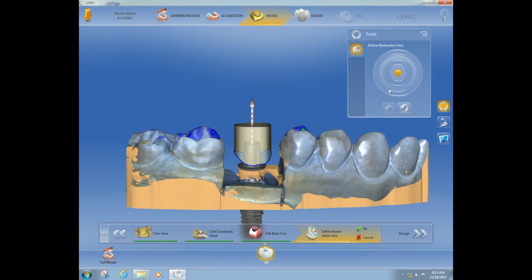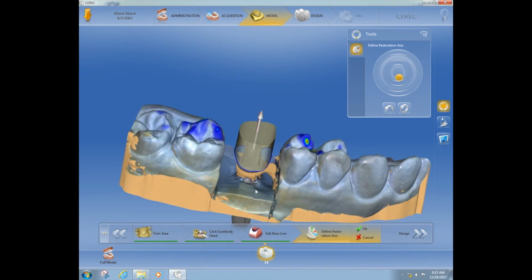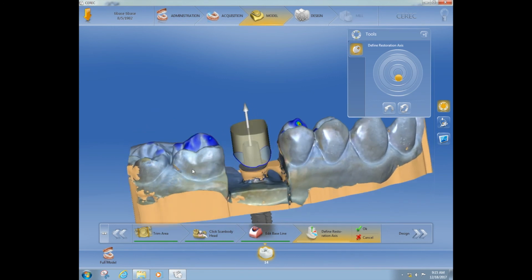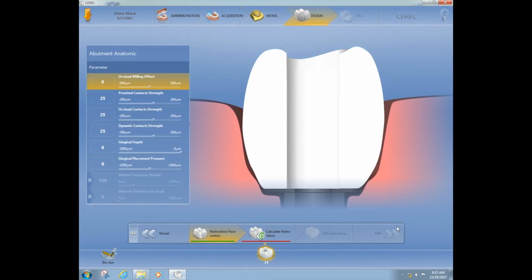To change it, you can do it up here. You see this little toggle button. You notice my crown or the path of draw is lining up, and I'm just changing that. You may have to change your rotation just to see that. I did it for you to show you that you can go ahead and align those. Those do not necessarily have to be aligned. It's just that dotted line showing you the path of the implant, and then you're just lining up your crown with your adjacent contacts. So luckily somebody at least placed that straight up and down, not necessarily buccal.